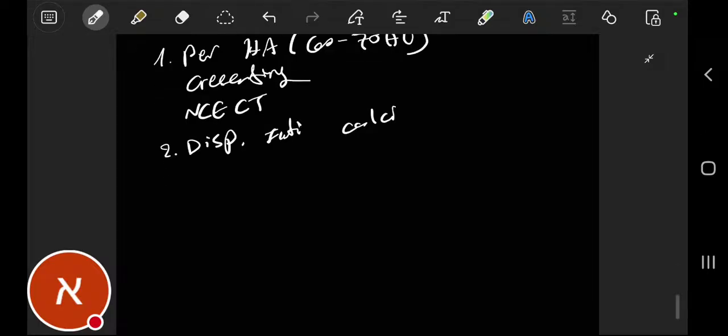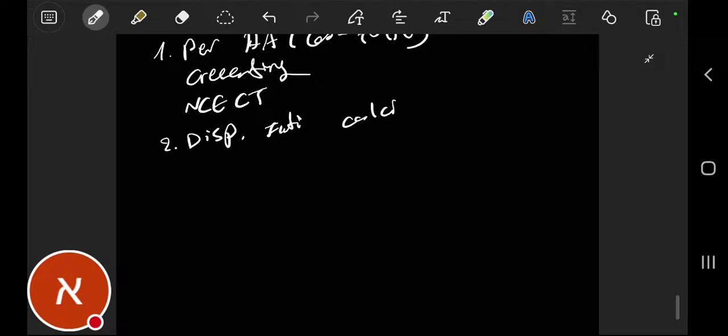Let's talk about ulcer-like projection, which may be found in this case. It is a contrast enhancement extending from the aortic lumen into the IMH via a visible communication. It carries a poor prognosis.